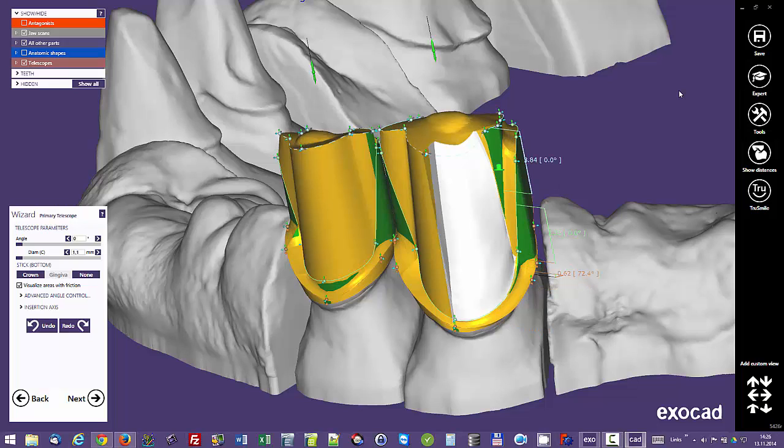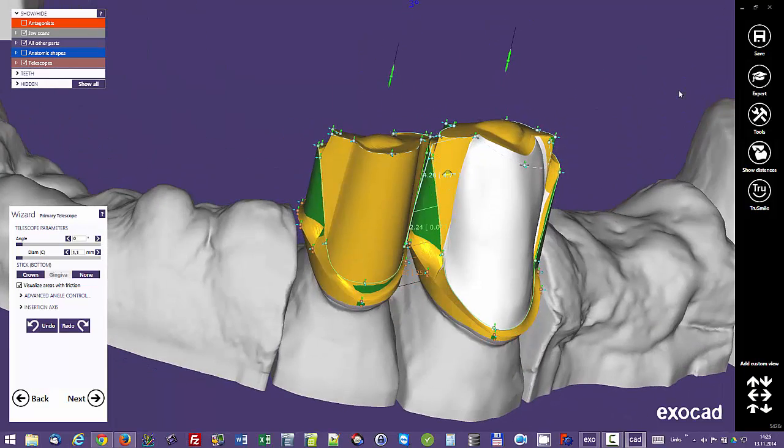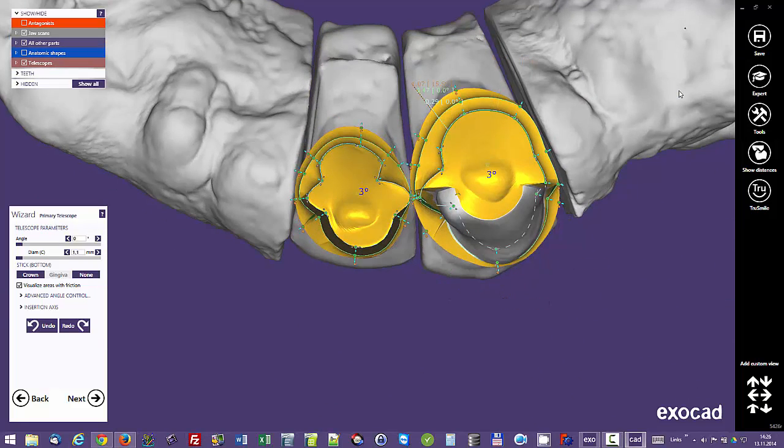The trick of my workaround is that you already defined the reduced parts with the anatomical teeth. Now you just have to click on the wall icons to switch to the anatomical option. And that just in the areas where you want the crown to look like a reduced restoration.